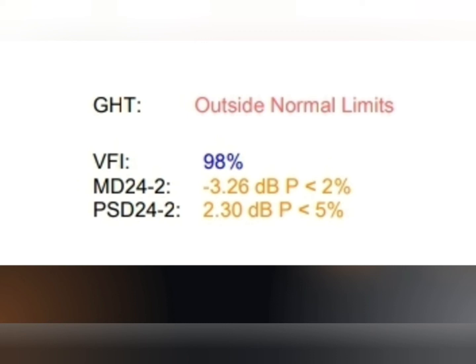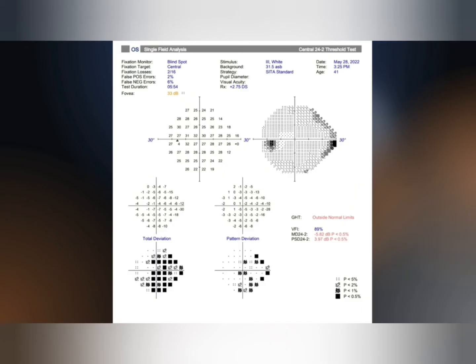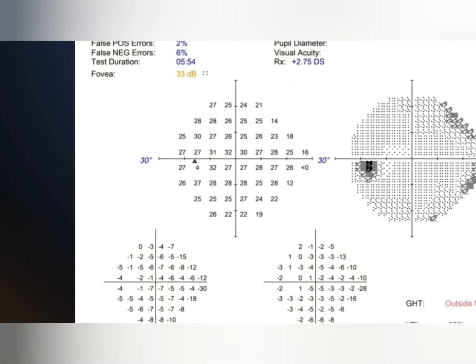And the glaucoma hemifield test compares the corresponding points of the upper and lower fields arranged along the horizontal axis. This GHT has 5 zones, and it compares each zone with its mirror points and finds the deviation and the arrangement, all those things. So the GHT can appear as outside normal limits, abnormally low sensitivity, abnormally high sensitivity, borderline, or within normal limits, something like that.